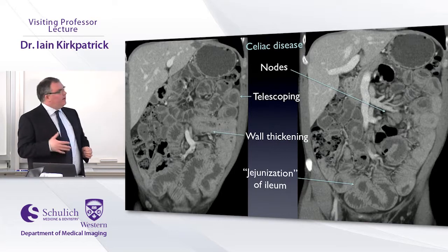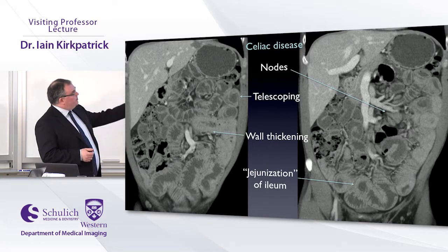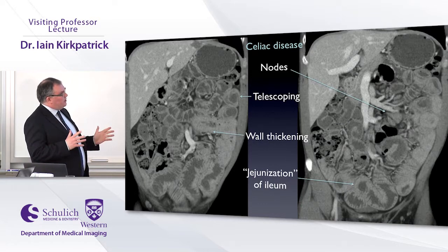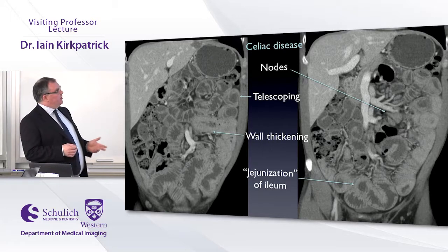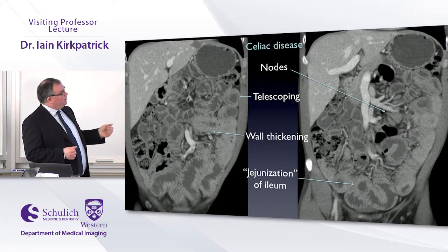But things get a little tougher when you're looking at the real enteropathies. So here is a beautiful case of celiac disease, but I am under no illusions. I think most people with celiac that get CTE probably have normal or near normal exams, because you have to be pretty severe to have significant changes. This case was previously undiagnosed, clearly pretty severe.